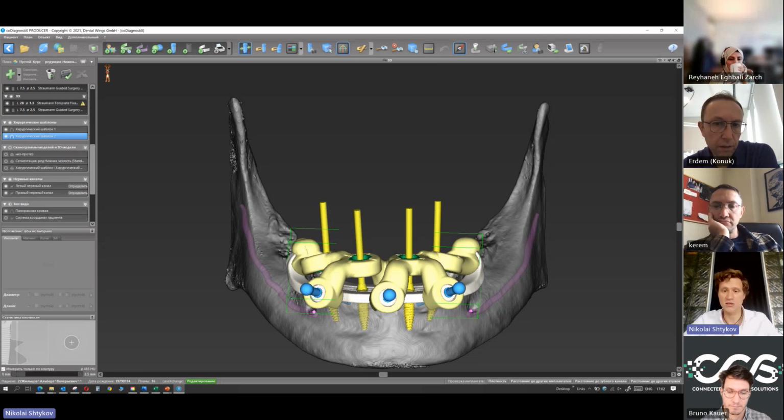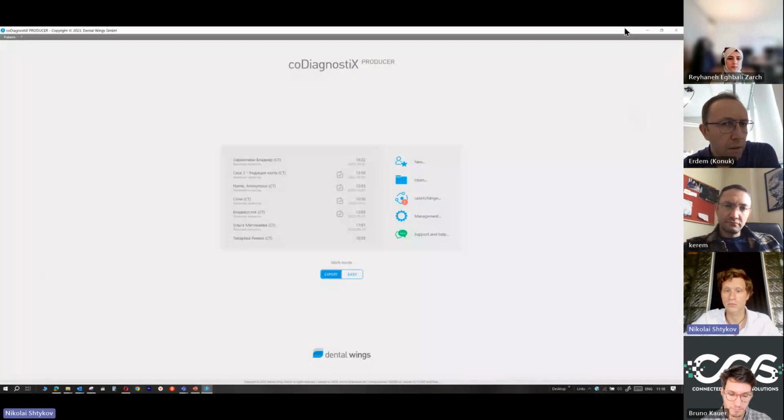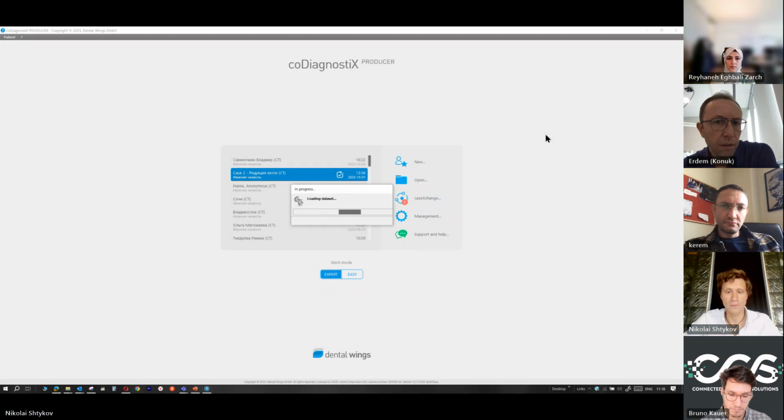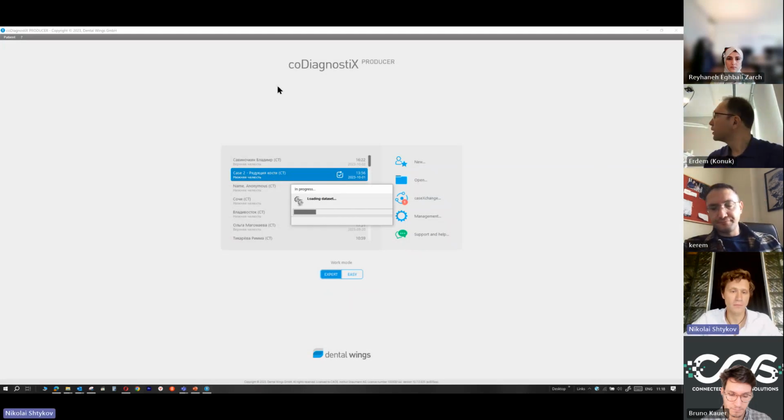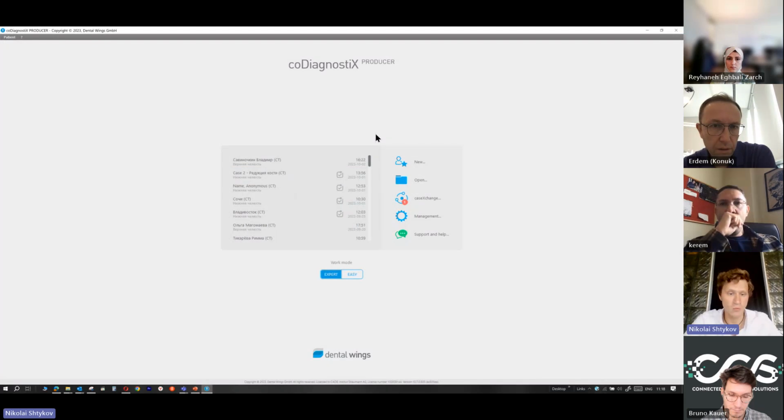Okay, let's go. And here I have the case, as I showed you just now.